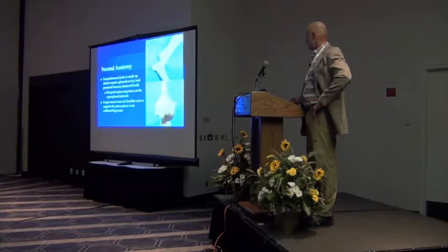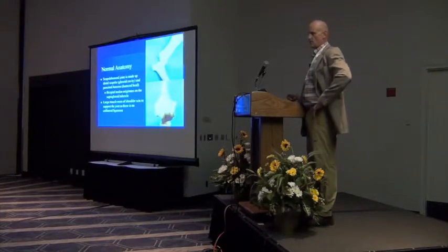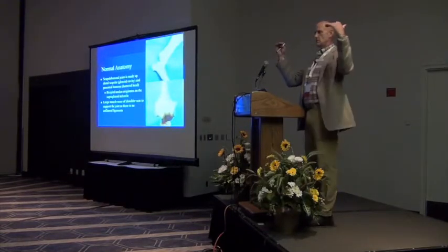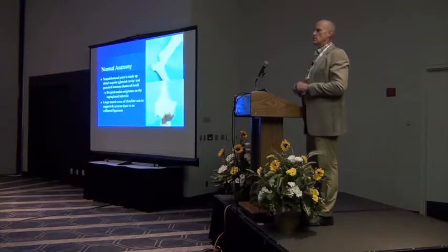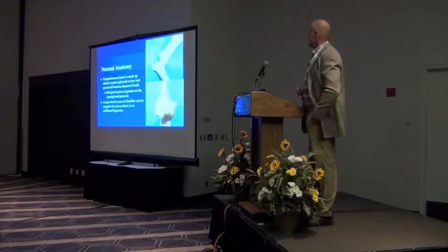And this just kind of shows you the discrepancy. Very large humeral head. And then the other thing that's important to remember from a radiographic projection standpoint is the medial border of the glenoid and the lateral border of the glenoid are not at the same level, right? So when you take a radiograph across there, they're going to be separate and appearing as lines across that humeral head. And then there is a little concavity associated with that as well. So quite remarkable osteology.